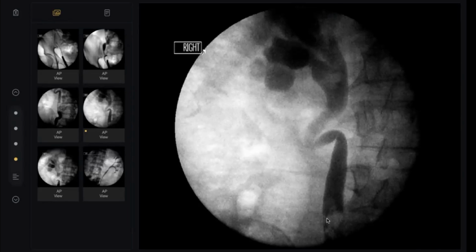What is the most important thing for you as a radiologist about transitional cell carcinoma? Sir, these are synchronous lesions. They are also seen involving the bladder as well as the ureter and renal pelvis. Thank you, doctor, so much.